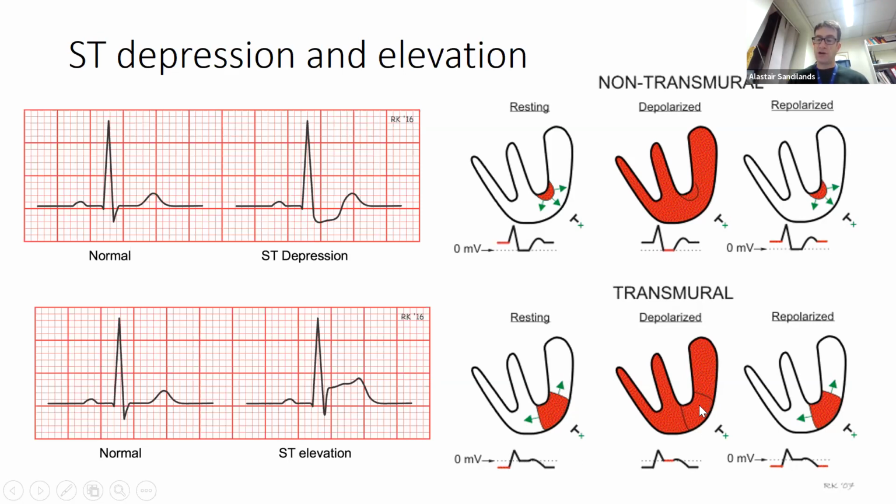Again, with depolarization in this example, there is 0 recording at the recording lead here, and our depolarization is being shown at 0 at the isoelectric line. And similarly on repolarization, it's going away from the recording lead, it's negative, so it'll be below the isoelectric line. However, we put all this now becomes our isoelectric line on the recorded ECG, and so we see therefore ST elevation in this example.